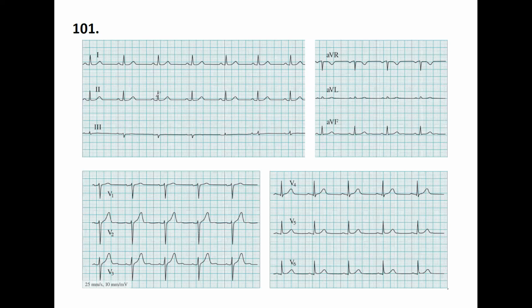For sure, normally the axis is saying what could be the anatomical axis. Its normal situation is proportional to each other. However, there are some abnormalities. When we do have an extreme deviation, that is called a pathological deviation, and some other abnormality can cause it, for example, a conduction problem, infarction. A lot of things can cause this, or an abnormal impulse formation center, and so on. So this is why we should do the axis as well in a situation.